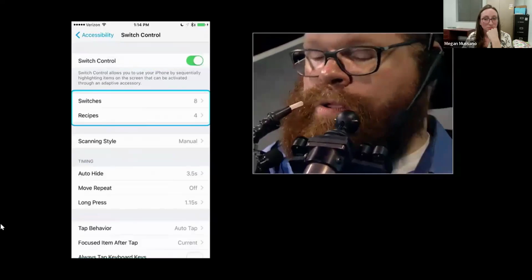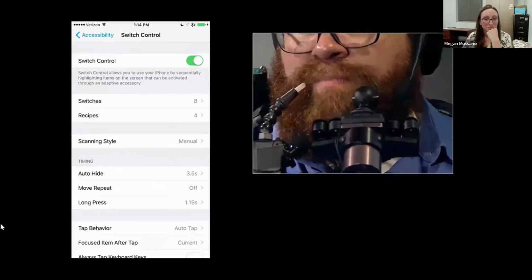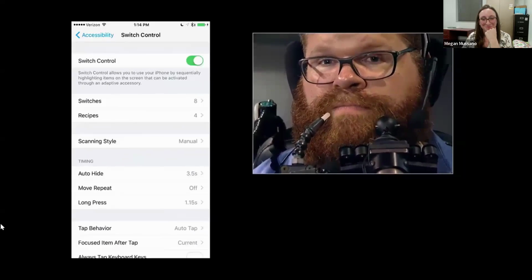Okay, get all that? Another button on this side for the wheelchair. Another button, wheelchair. Another button, volume down, volume up. Whoop whoop for long press. Water straw for drinking.